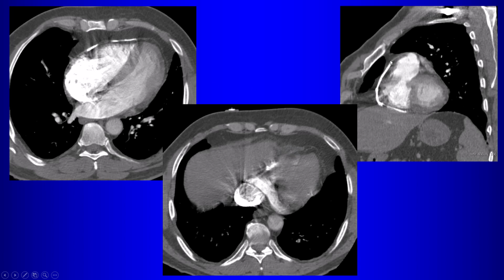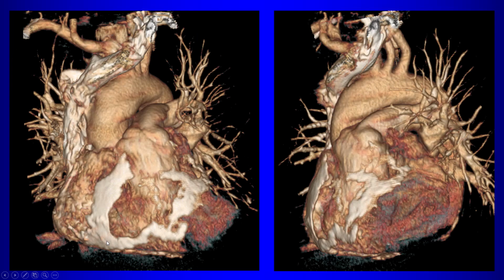Here on the short axis view, we can also see these calcifications. And then we also notice there's a dilated coronary sinus here and dilated inferior vena cava. So this is physiologic evidence that this patient most likely has constrictive pericarditis secondary to their calcifications here. Notice also that the interventricular septum is deviated towards the left ventricle.